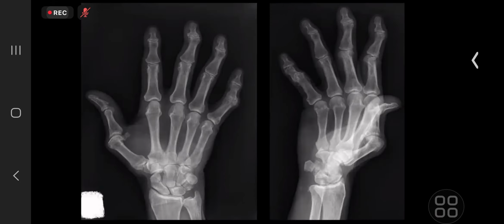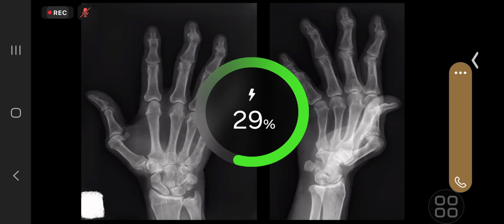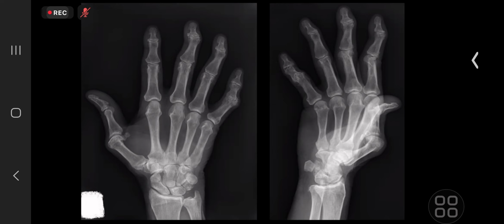Okay. Where do you think the pathology is focused predominantly? Which joint space? Within the interphalangeal joints, and predominantly the proximal interphalangeal joints of the little finger. Okay, so your primary diagnosis is? I think this is osteoarthritis. Okay, what are the differentials?